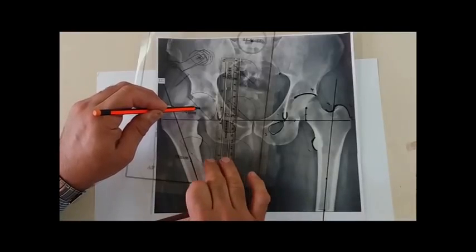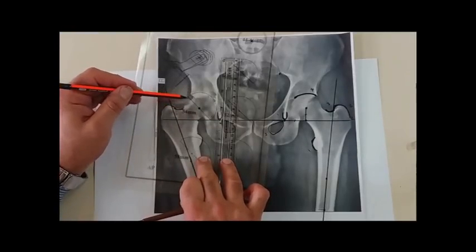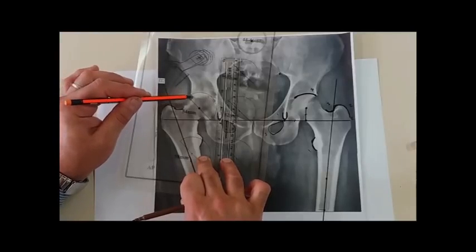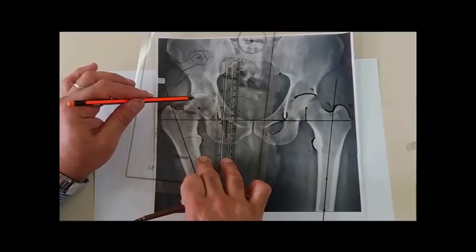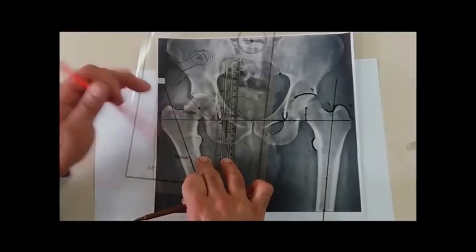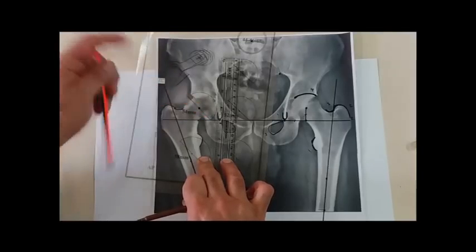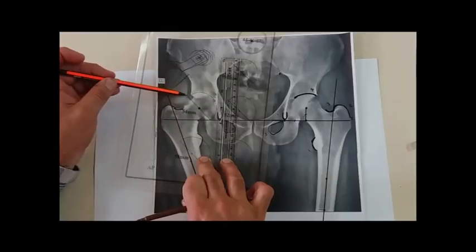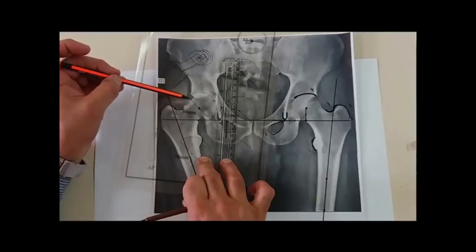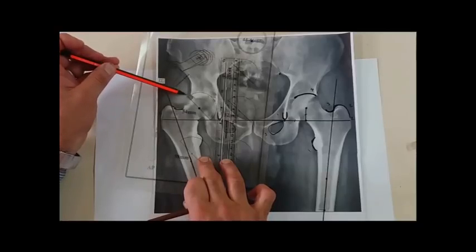Of course, when I template this angle of inclination of 45, I should have some uncoverage superiorly, because normally the acetabulum is inclined about 50 to 55, while in templating and in replacement we usually incline the acetabulum 40, so we make it more horizontal than usual. This means there should be some uncoverage here. If this uncoverage is less than 10% of the surface of the acetabulum, it is acceptable. If it is, for example, around 20%, it is not acceptable.